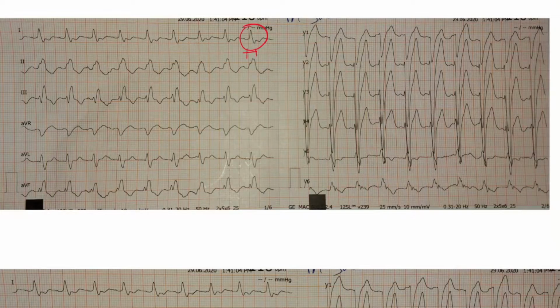Now let's look at this example. You've got IVCD, broad QRS, look at V1 and V6. So you've got a predominantly negative V1 and a predominantly positive V6. If you map it out, it's going more towards the left side. Now you notice that there is no notch in V1. That's why I wouldn't ask you to stick to the William mnemonic for this. Just try to recognize that pattern that the left bundle branch block makes on the ECG.